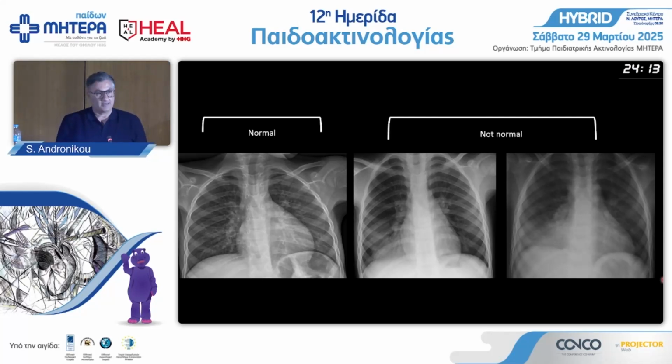And this is what the AI tools will do for you at the moment. They will tell you that the X-ray is abnormal. They can point at the parenchymal abnormality, but tuberculosis is a different story. We don't only want to know what the child has. We want to know if the child has tuberculosis. Okay? So in this one we see consolidation, airspace disease, however you call it.